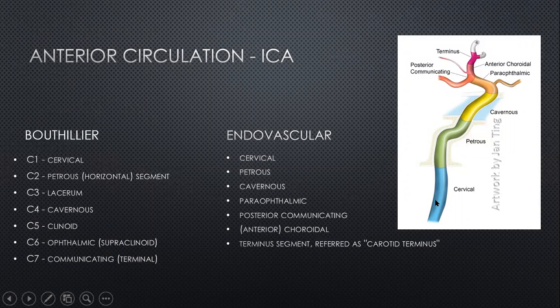But in essence, basically it is to talk about the course of the artery as it comes through the neck, and hence that's the cervical course, then through the petrous segment.